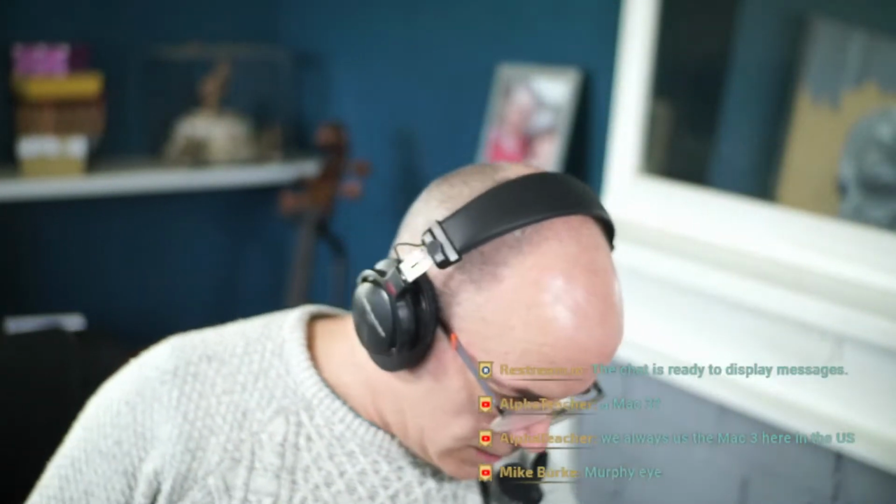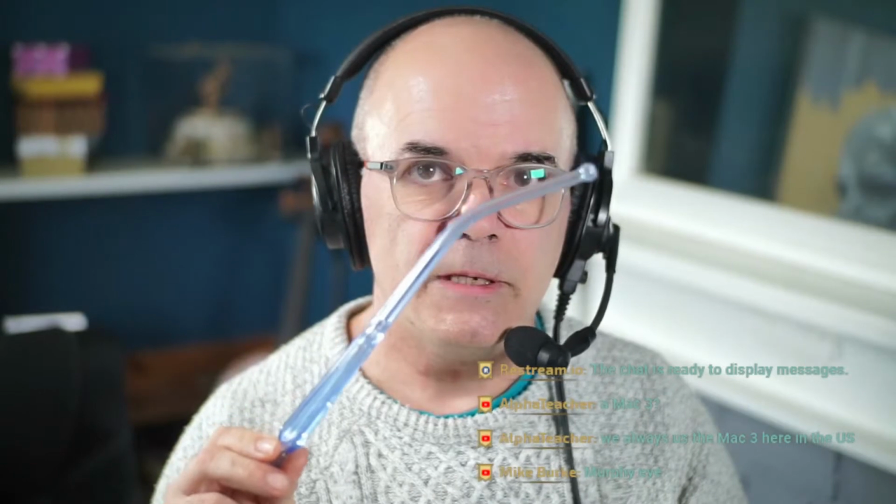You'll also need one of these. I should have said this at the start. I haven't done this in a very good order, have I? You're going to need, and we're all very familiar with these, this is your Yankauer sucker. Make sure that that's ready to go.